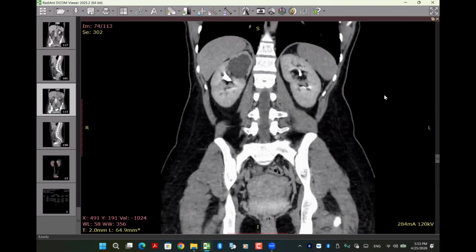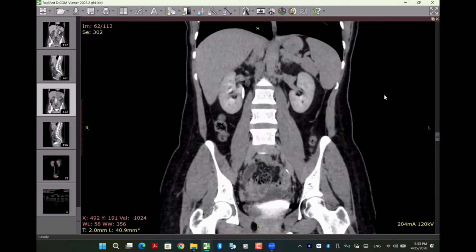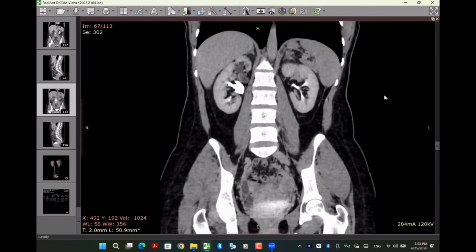Can you state what study we will do? We could do the nuclear scan. No, before the nuclear scan. If you want to confirm, can I tell from this scan if I have a reflux inside the lower moiety ureter?